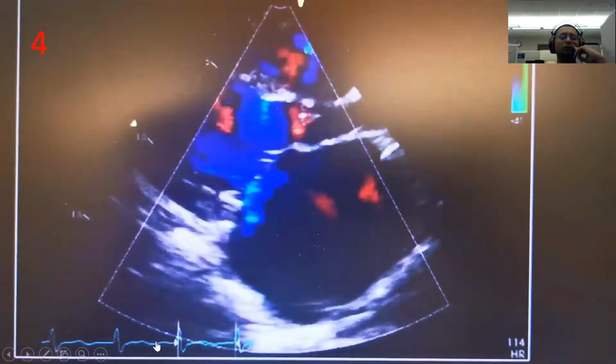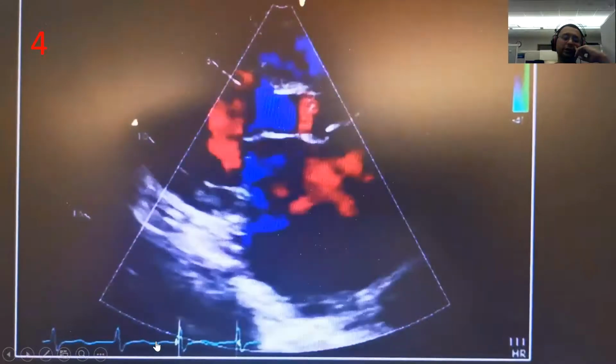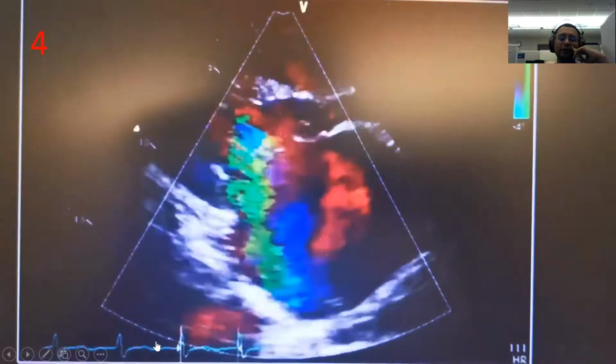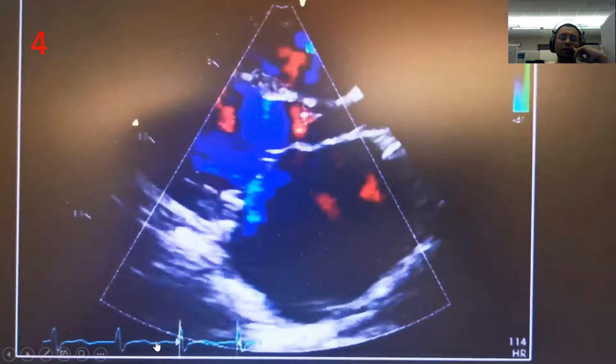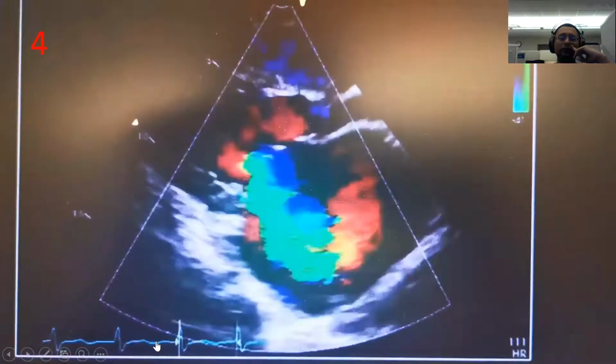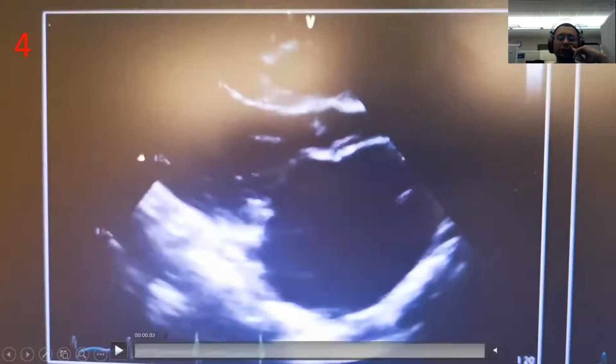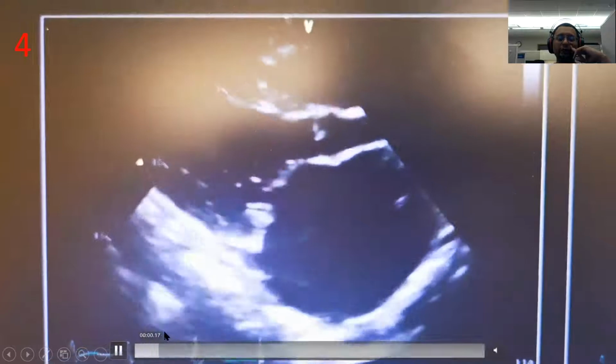That also looks like a severe mitral regurgitation. Look at the severe mitral regurgitation. The jet is directed posteriorly. Just look at the color view and look back at the parasternal long axis view. So what do you think of the etiology of this mitral regurgitation?